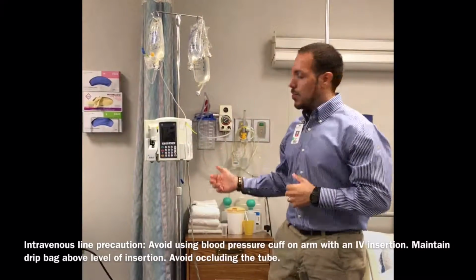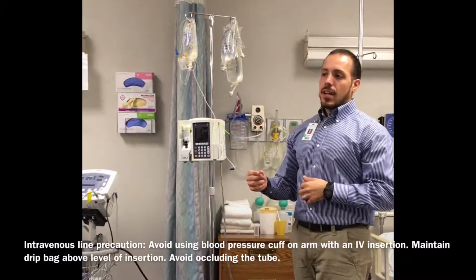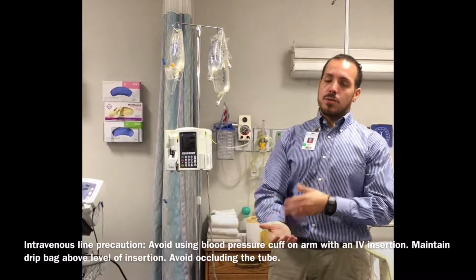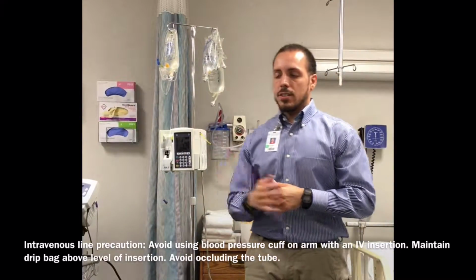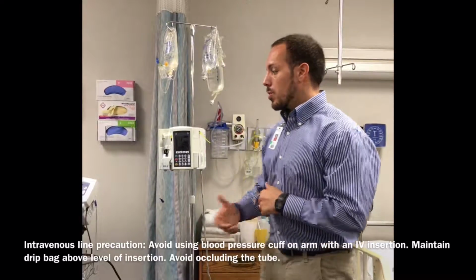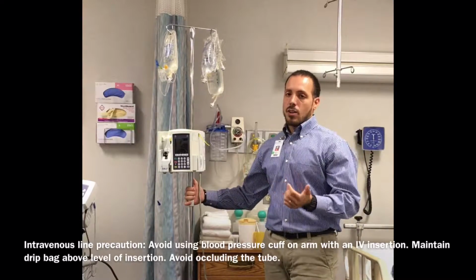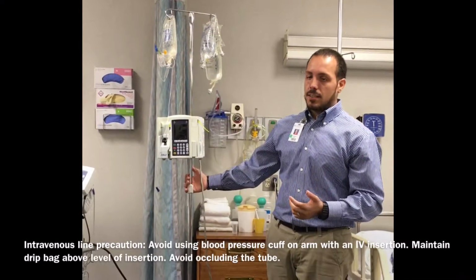Okay, so our first device is going to be our IV line, which you see behind us. The IV line is used for the infusion of liquid substances into the veins, and that could be peripheral or central, which we'll get into with the catheters later. But what we should know is that when we ambulate our patients, we should be taking this pole right along with us and not disconnecting the lines.